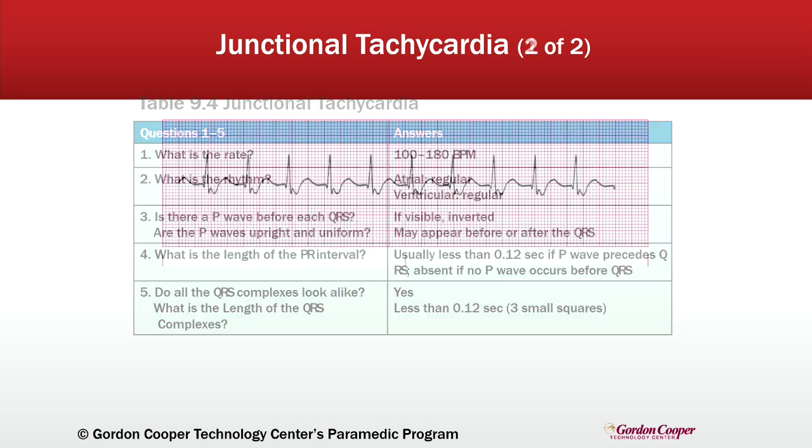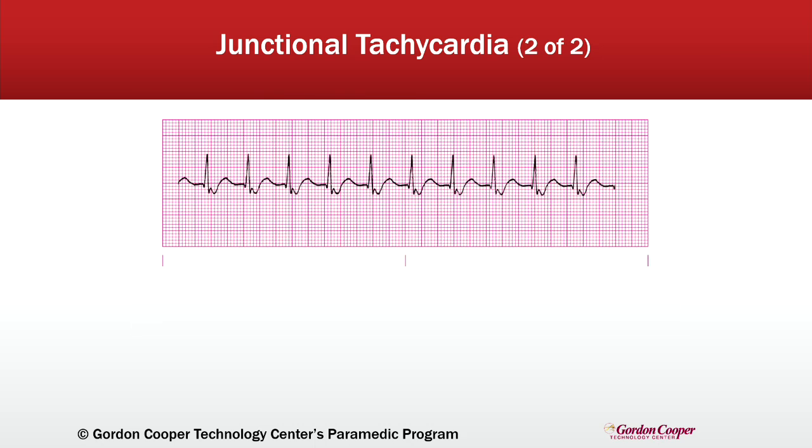Look at it a little bit faster. So when we look at this, we see 1, 2, 3, 4, 5, 6, 7, 8, 9, 10. So we've got a rate of about 100.